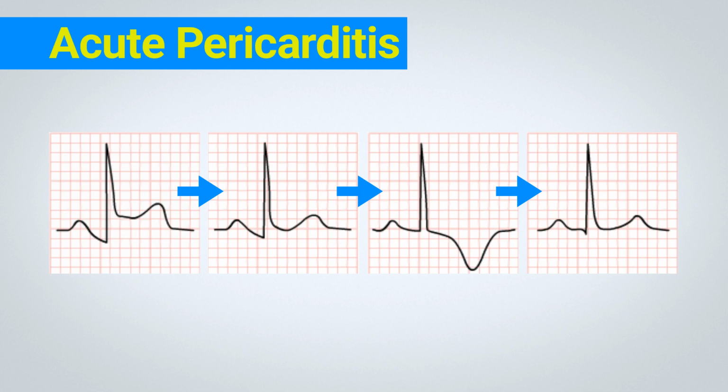In certain patients, pericarditis episodes may recur or relapse either intermittently or over sustained periods. The corresponding ECG findings can vary greatly, sometimes reflecting the characteristics of acute or evolving pericarditis. The presence of pericardial effusion may lead to low voltage.